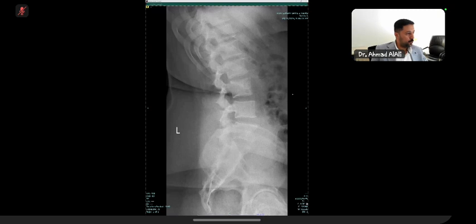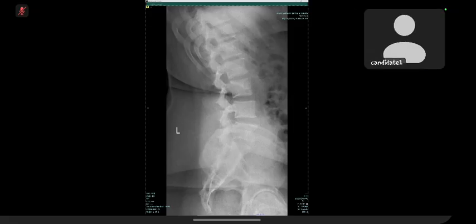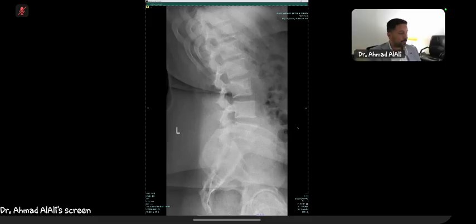So it looks normal to you. Any pathologies in there? Any findings? In this, the posterior elements of the L4 vertebral body look slightly sclerotic to me. Yeah, skip that. Anything else?